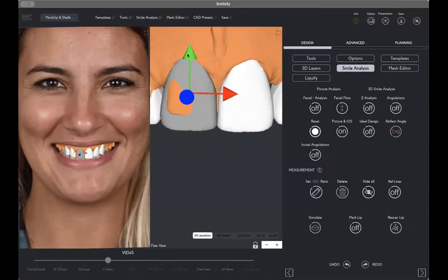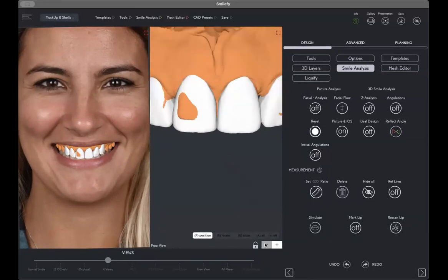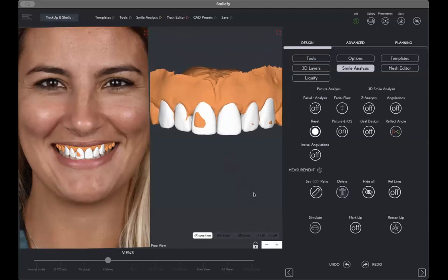All these tools, again, visual references, automatic calculations, make sure that everything we have is in harmony, is straight, is symmetric, is beautiful. Because I see many cases, and I don't like, for example, when you see a canine is like this. A canine is out, one is in. There are small details in a smile that you can correct, and you can make sure that everything is fine.